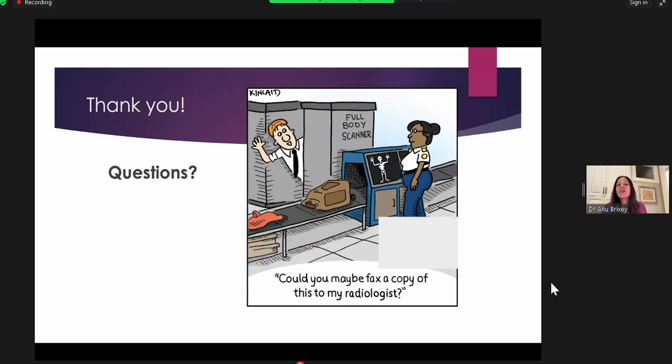Once you identify that, the other things I start to do at that point are look and see, do I have other findings in other parts of my lungs? Do I have other nodules? Do I have lymphadenopathy, and what does that lymphadenopathy look like? Because the lymphadenopathy you see with TB can look very different from that in malignancy, but they can often look the same. And when we do chest CTs, we also get the adrenal glands, and lung cancer loves the adrenal glands. So I always look at the adrenals to see if I have something that looks like a metastasis, or even in portions of the liver. But the point I'm trying to make is that you often can't differentiate whether it's from malignancy or from tuberculosis.